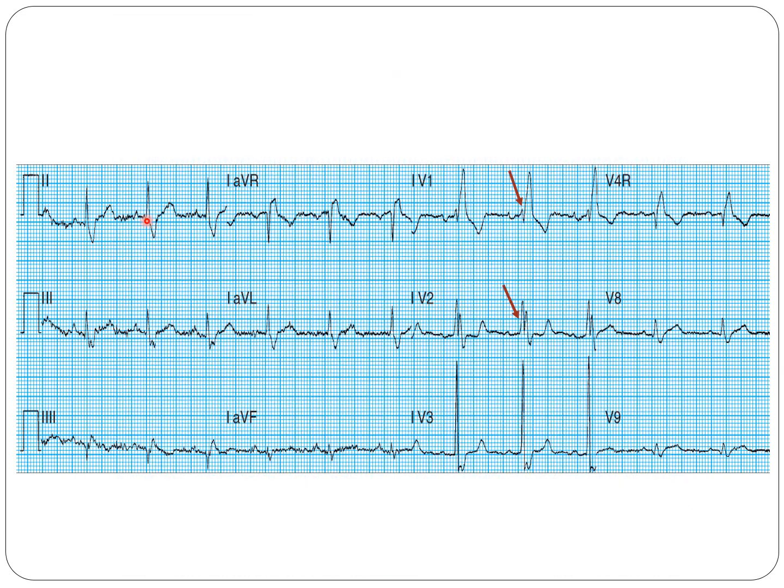Because the QRS is wide, looking at the right side and the left side. On the right side, you can see an RSR complex in V1, and on the left side, in lead 2, for example, you can see a wide S wave representing a complete right bundle branch block. Axis is normal, so there's only a right bundle branch block with secondary ST-T changes, where we have the big R waves mainly in V1. All right. There is no MI at all. You don't see any Q wave and ST elevation.